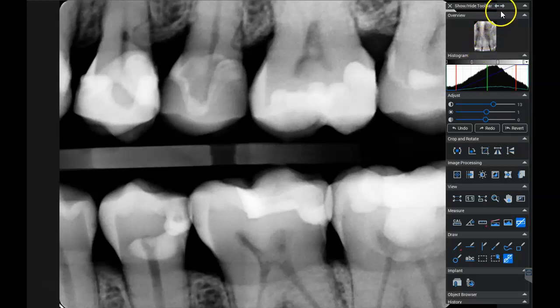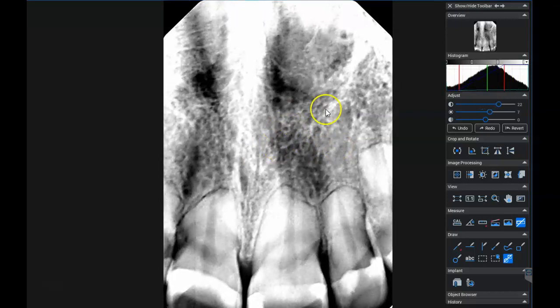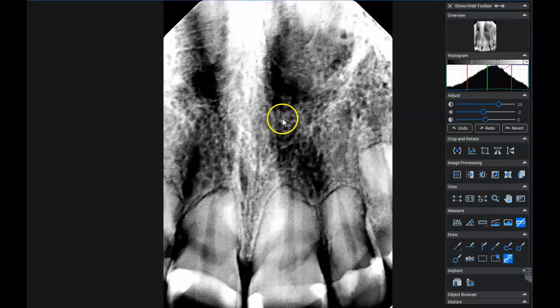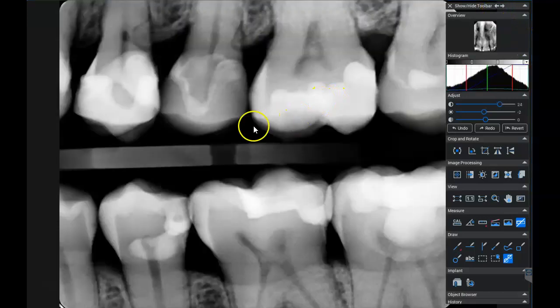So interestingly again, if I advance to the next image and it shows the one that was there, that one will change appropriately.